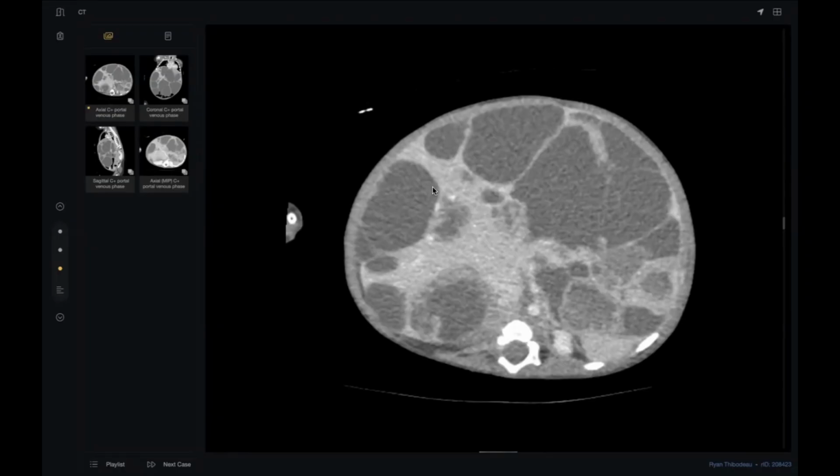Also, they differ in the characterization of the enhancement pattern. The hepatoblastoma does enhance in the arterial phase as it takes blood supply from the hepatic artery, and the hemangioendothelioma usually shows gradual fill-in, as the hemangiomas in the elder population.